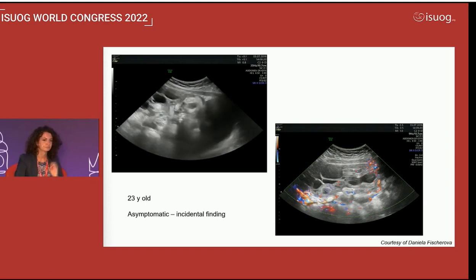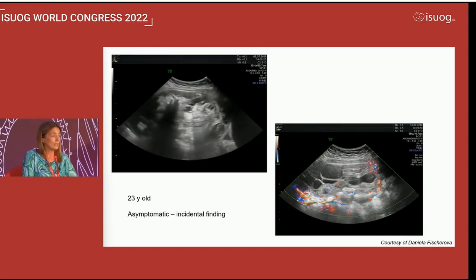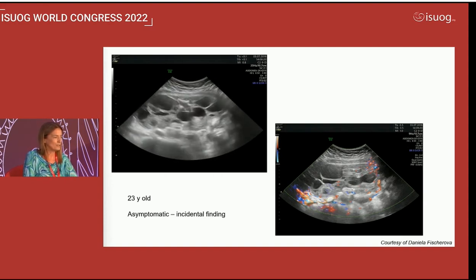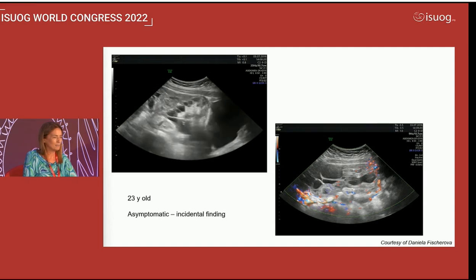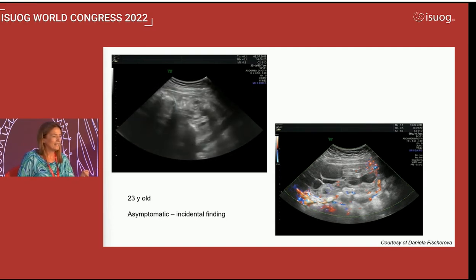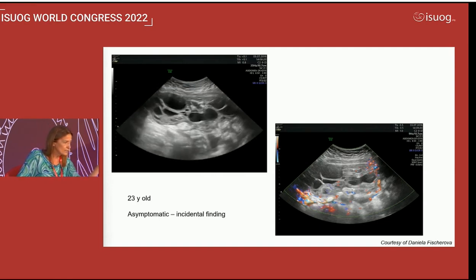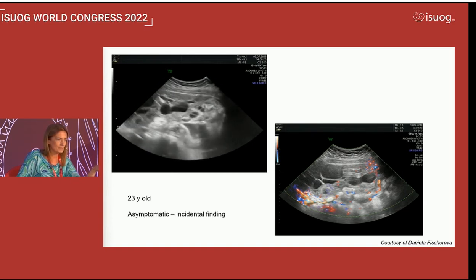But here, what I wanted to emphasize is this structure that I tried to describe in a strange manner, mentioning an Italian food, tortellini, but for my colleagues it's difficult to understand what I mean. And then Luca Savelli taught me and other colleagues, he noticed these hyperechoic areas with shadows behind.